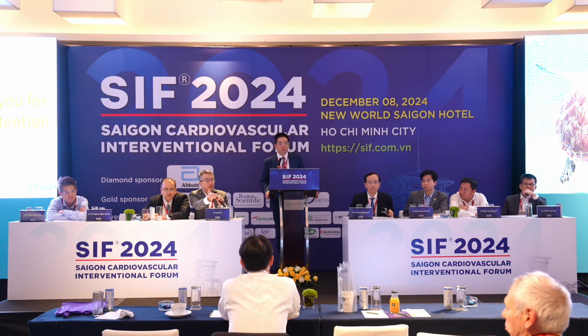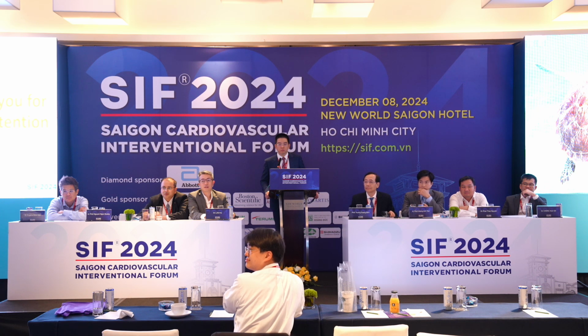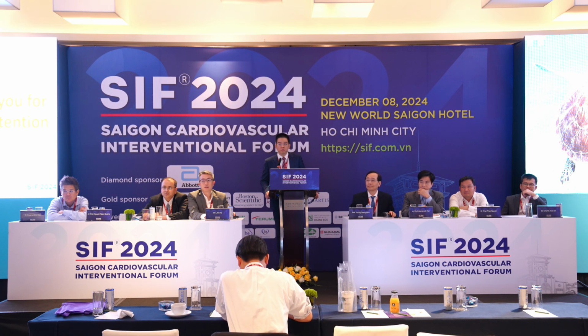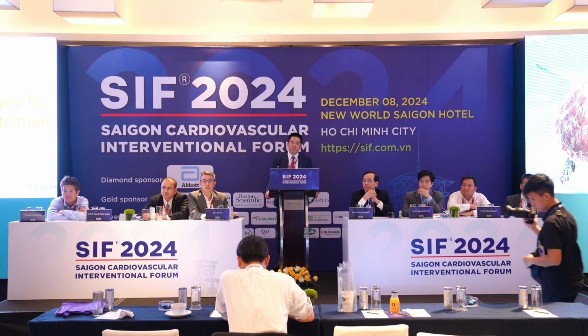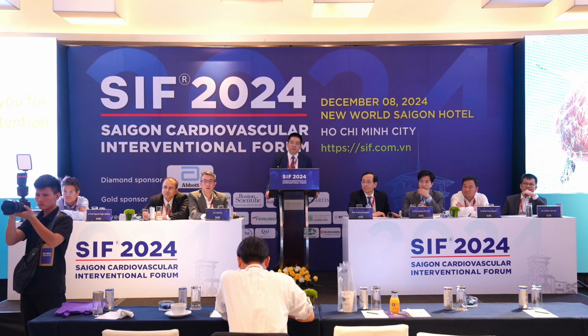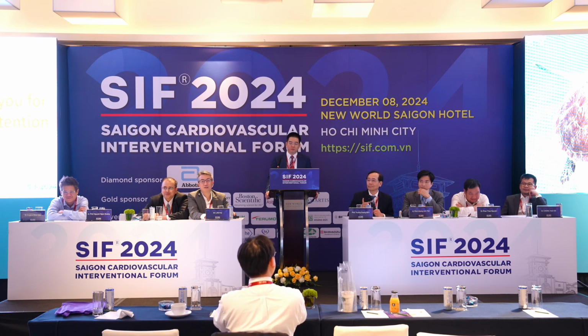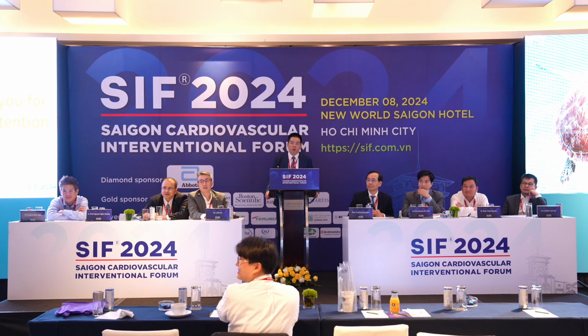Okay. Eric has some points too. First, a comment. It's not a question, just to share a stupid thing I did. Sometimes we use the filter device for a critical vein graft, and when it's very difficult to pass, sometimes I use a buddy wire, and mostly I use the Boston filter. What happened to me once, I didn't pull the buddy wire and I stented on the wrong wire. That means you jail the filter. Has anybody had this complication before? It's stupid, of course. So what I did, I just pulled the filter out and crushed the stent. I just recrossed the stent and nothing happened.